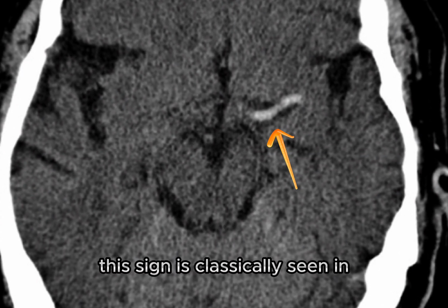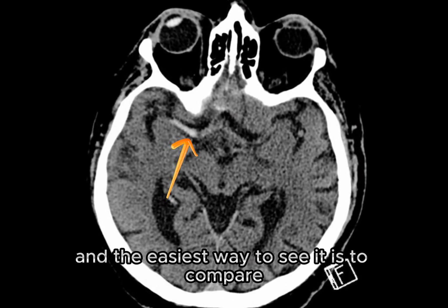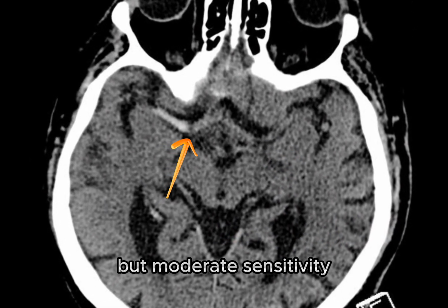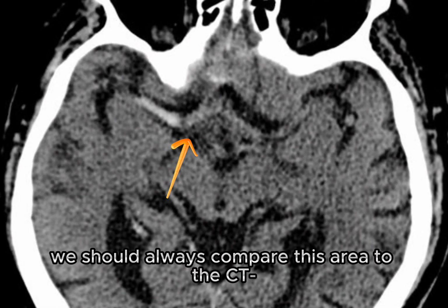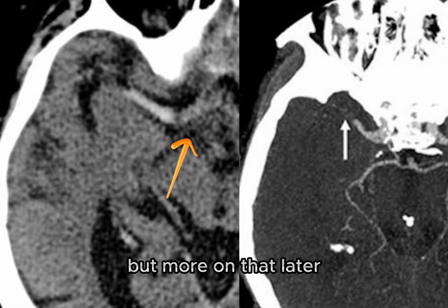This sign is classically seen in the proximal segment of the MCA, and the easiest way to see it is to compare the vessel density to the contralateral site. This sign has a relatively good specificity but moderate sensitivity. For any suspicion of a hyperdense vessel sign, we should always compare this area to the CT angiogram to confirm our finding, but more on that later.